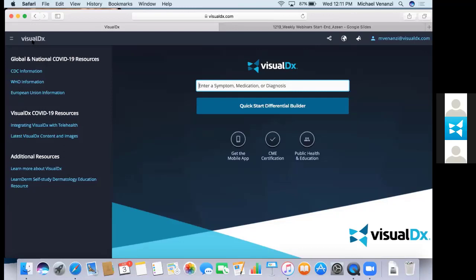Great, thanks, Azeen. I'm going to move along to the other approach to VisualDx, which is the forward-thinking approach. And what I mean by that is many times clinicians are left with uncertainty as to what type of diagnosis it is, but the patient's presenting with a chief complaint. And VisualDx has a great guided workup approach for our students, our clinicians, to utilize VisualDx to not only be familiar with the right questions to ask, but to create a thorough differential so that after you've entered in all the findings, you can take really a closer look at all the possibilities that are out there, which are associated with the findings that the patient is presenting with.